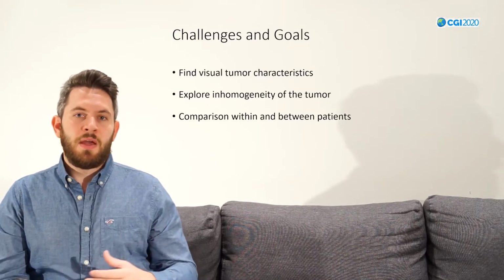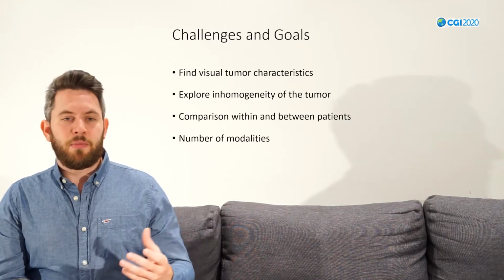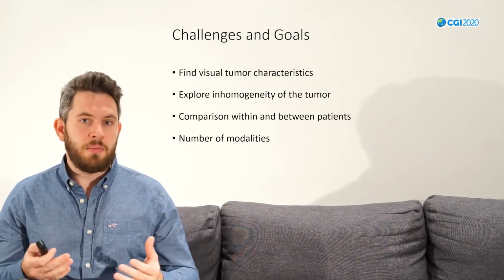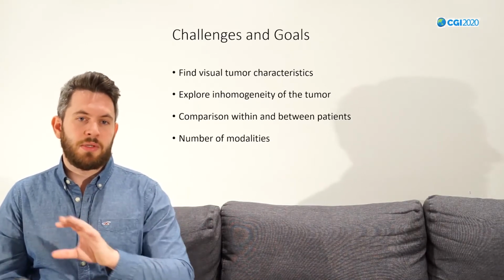And the last thing, which is also challenging for the radiologist, is the number of modalities. Five, seven or whatever modalities is a quite high number, and it's not so easy to compare them anymore if you just have, for example, slice views.